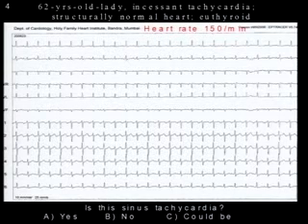Okay. So if we discuss this ECG, by itself the ECG shows a P wave preceding each QRS complex. In fact, if I can use the mouse, we can see a normal P wave. I call it normal because the P wave is positive in 1, 2, AVF, V4, V5 and V6. So 6 leads which need positive P waves have positive P waves. So yes, it could go as a sinus P wave if we look at the ECG in isolation.